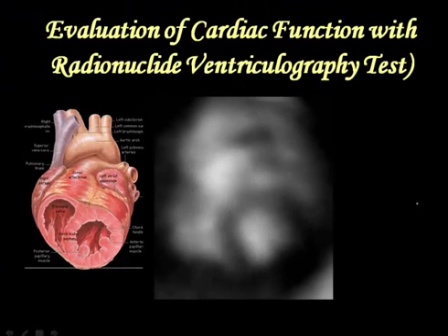And how about this one here? Here's another type of radionuclide study, where you are seeing the left ventricle as it's contracting. The inside is looking bright, the outside is where the myocardium and everything is. It's on the periphery here. We're just watching it beat.